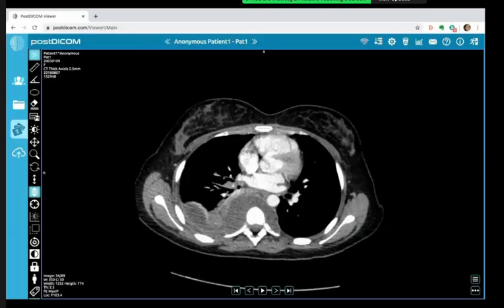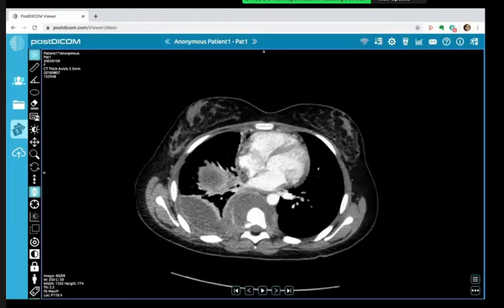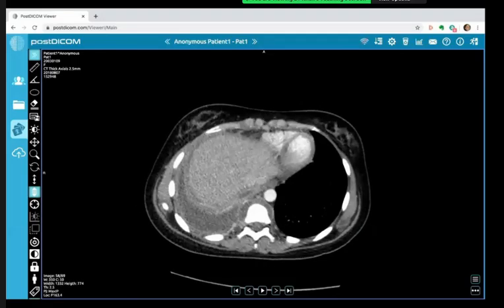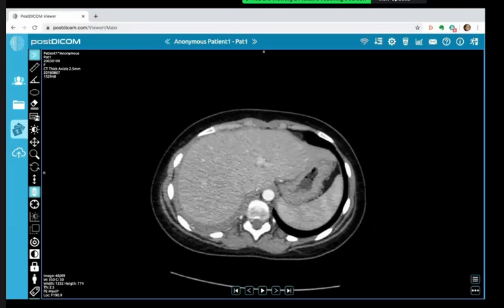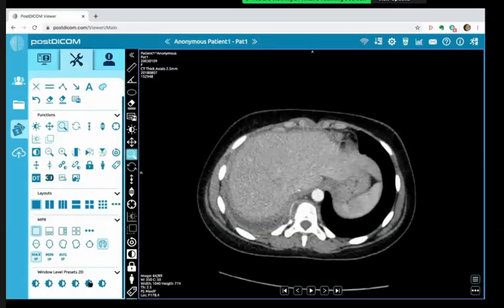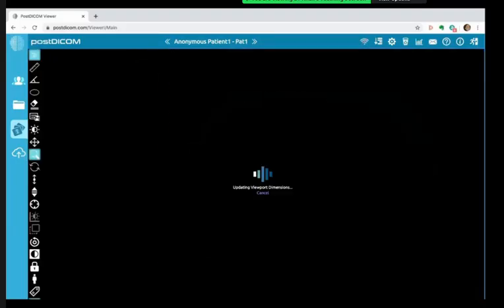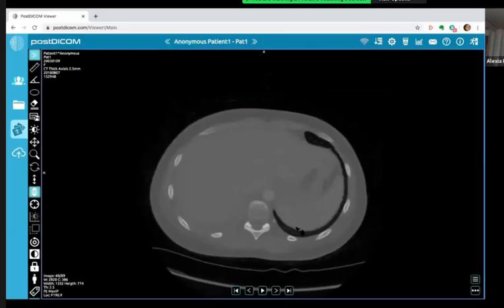I can see abnormal paraspinal soft tissue, as well as posterior basal pleural thickening with the split pleural sign and enhancing wall. So this is a complication of the pneumonia. It's an empyema. This needs urgent drainage via chest drain or a pigtail insertion. I think this also might be complicated by a paraspinal extension of this pyogenic process. Well done. There's a paravertebral collection, isn't there?